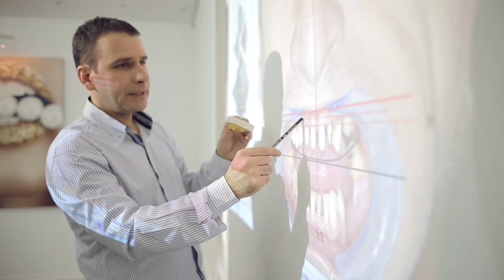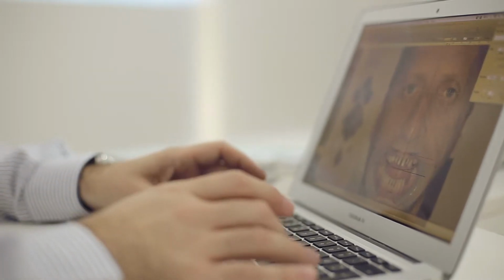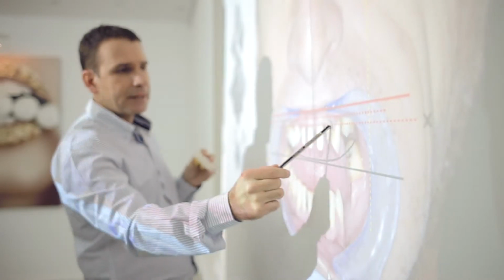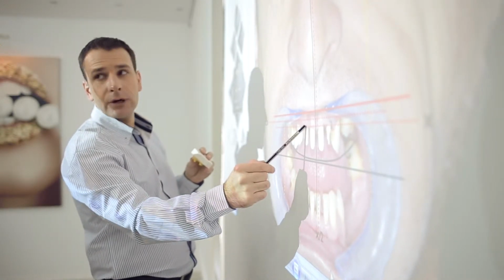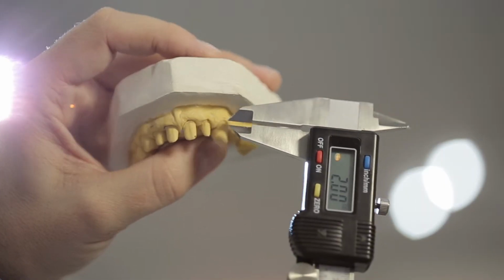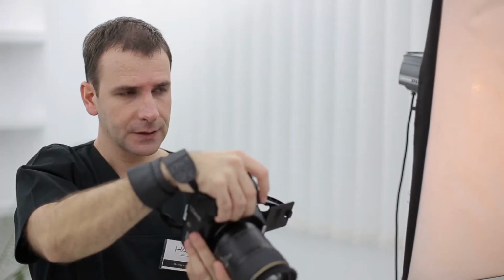The Lite version can quickly and easily determine and outline the facial axes and the incisal edge by a simple automatic analysis of a portrait photo of the patient, and facilitates the further transfer of the information to the dental laboratory, thus rendering a precise guidance for any design in aesthetical dentistry.